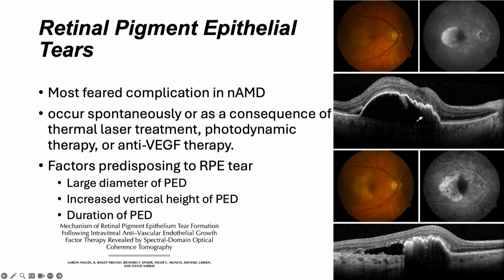Coming to RPE tears, these are the most feared complications in neovascular AMD, which can happen either spontaneously or even as a result of treatment. And the factors which predispose are the large diameter of the PED, the increased vertical height, and the duration of the PED.